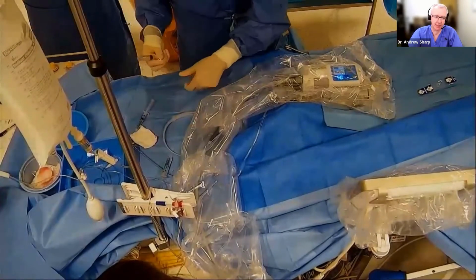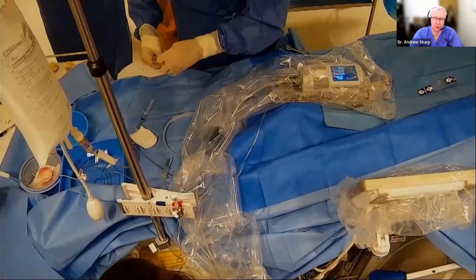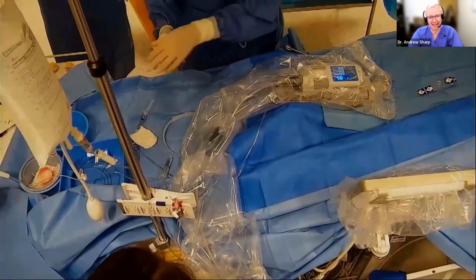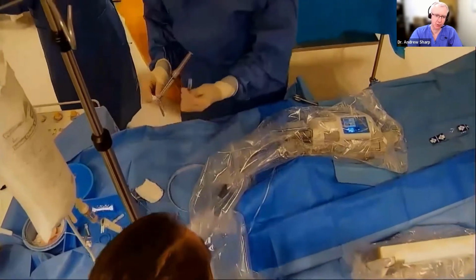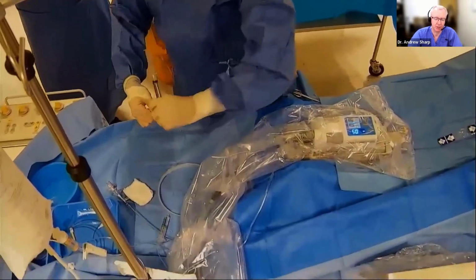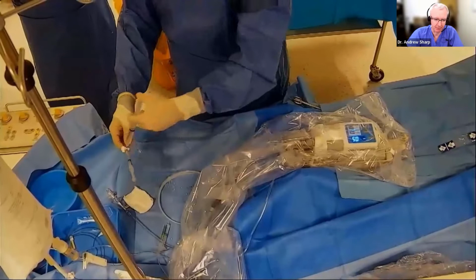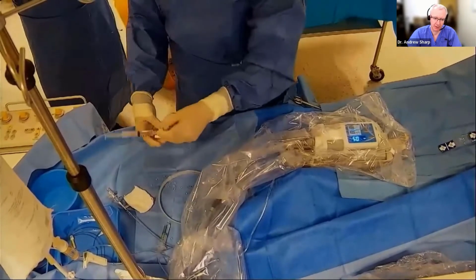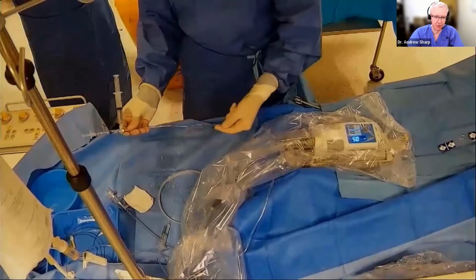And then we start prepping the IVUS device. So you can see here, we've got a 3-way tap on an extension. So the 3-way tap goes onto the back of the extension. And then we put a 10 mil Luer-lock syringe, which comes in the pack, on one side as a fill syringe. And then we use our injector 2 mil syringe coaxially with the piece of cable. We fill the 2 mil syringe with the donor 10 mil syringe. And then with the 2 mil syringe, we flush through.